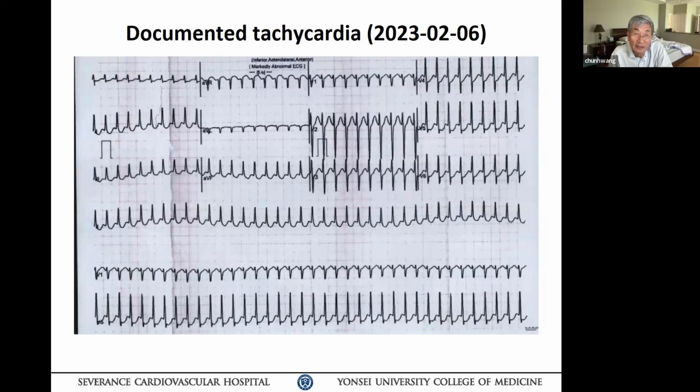So you got tachycardia here. What do you see here? Do we see any evidence of retrograde P wave anywhere? Anyone see it? Please say so, and then tell me what it is. Probably in V5? What do you see? A little bump?